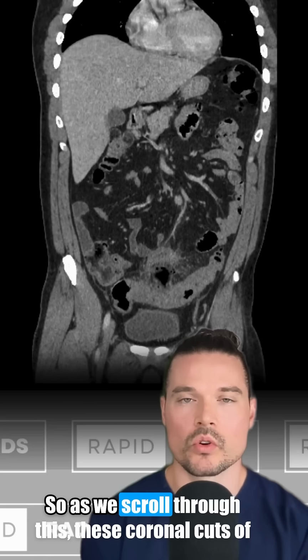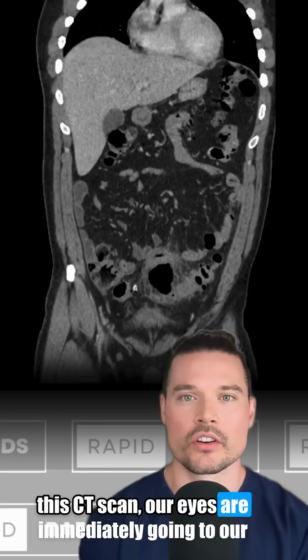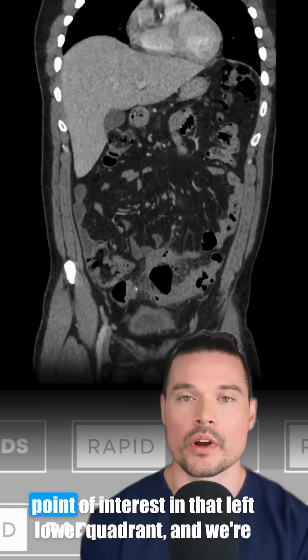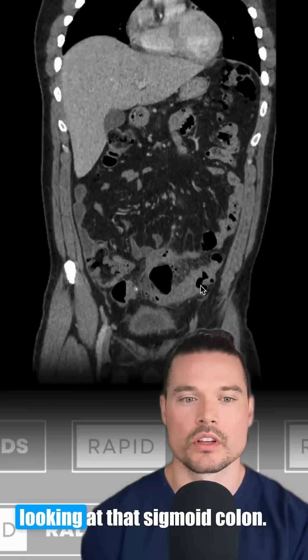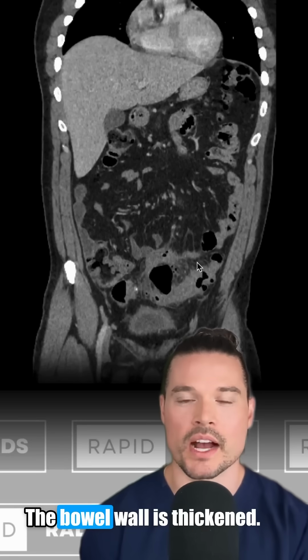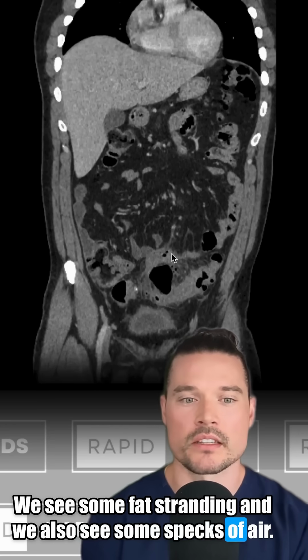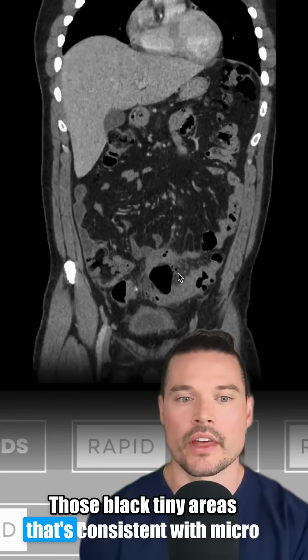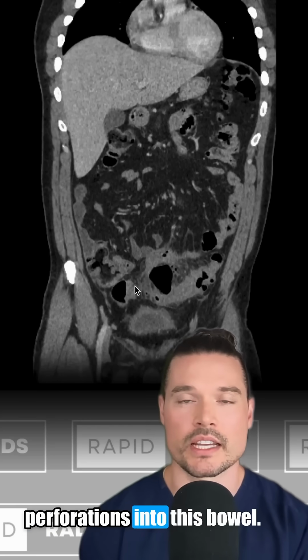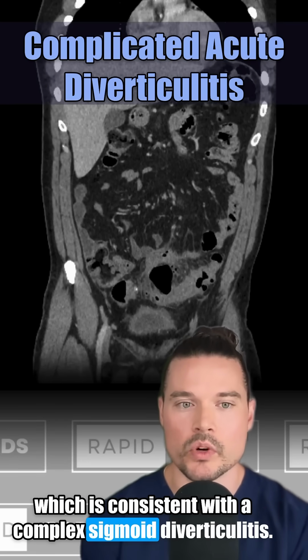So as we scroll through these coronal cuts of this CT scan, our eyes are immediately going to our point of interest in that left lower quadrant. We're looking at that sigmoid colon, and it looks mean. It looks inflamed. The bowel wall is thickened. We see some fat stranding, and we also see some specks of air, those black tiny areas. That's consistent with microperforations into this bowel, which is consistent with a complex sigmoid diverticulitis.